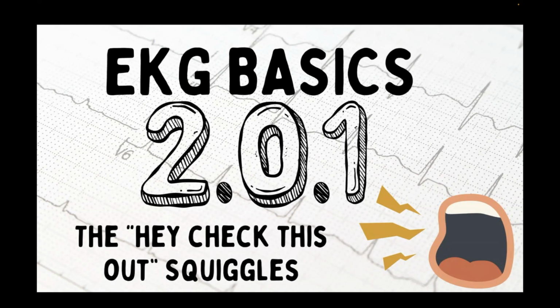This will round out our EKG basics. You hook the patient up. What do these rhythms mean to me? This one is 2.0.1. Hey, check this out, squiggles. These are the ones where an EMT or EMR hooks the patient up and something just doesn't look right, and they want to let somebody know now.